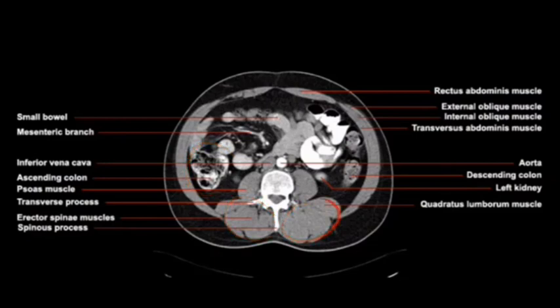Something else we can see at this point is another muscle which is associated with the abdominal cavity, and that's called the psoas muscles. These psoas muscles are actually inside of the abdominal cavity. We remember that they're different from the erector spinae because the erector spinae muscles are on the outside, psoas muscles are on the inside. It probably goes without saying, something we haven't mentioned to this point in this lesson is that this anterior structure here is what we call the rectus abdominis muscles. These are your typical abdominal muscles.